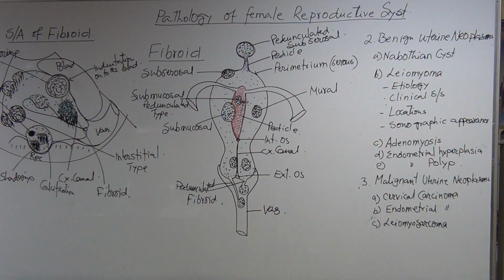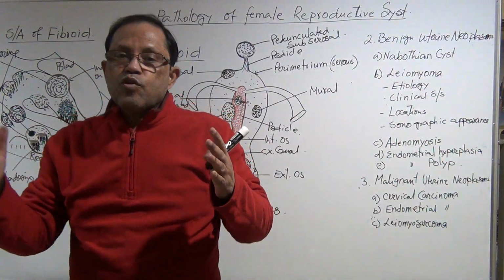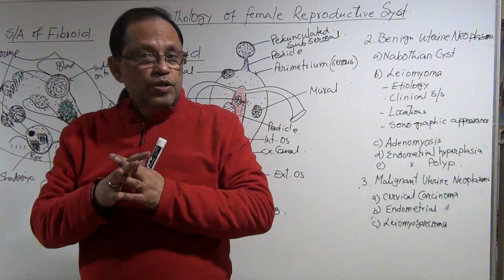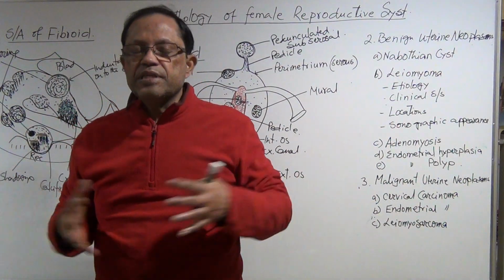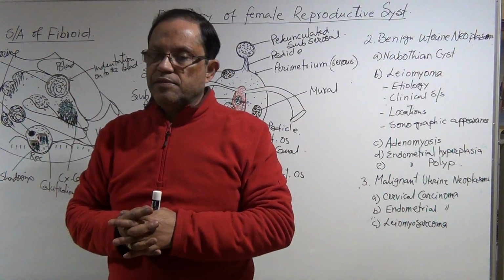If it's like that, the whole uterus is bigger in size, irregular outline, contour is lost, and a lot of shadow, calcifications, even necrosis, you can see it. Hardly you can see the endometrium, I'm telling you.